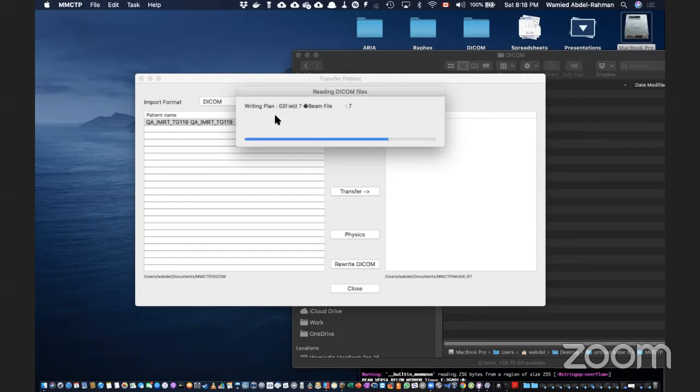And of course, because the Linac that I've used to generate the plans for this patient is TrueBeam rows, it knows that it has a plan, a Linac defined called TrueBeam rows. If not, it will give you a warning message that, okay, I don't have a Linac with that name. So for example, we have a TrueBeam Ocean machine, but it's not configured.